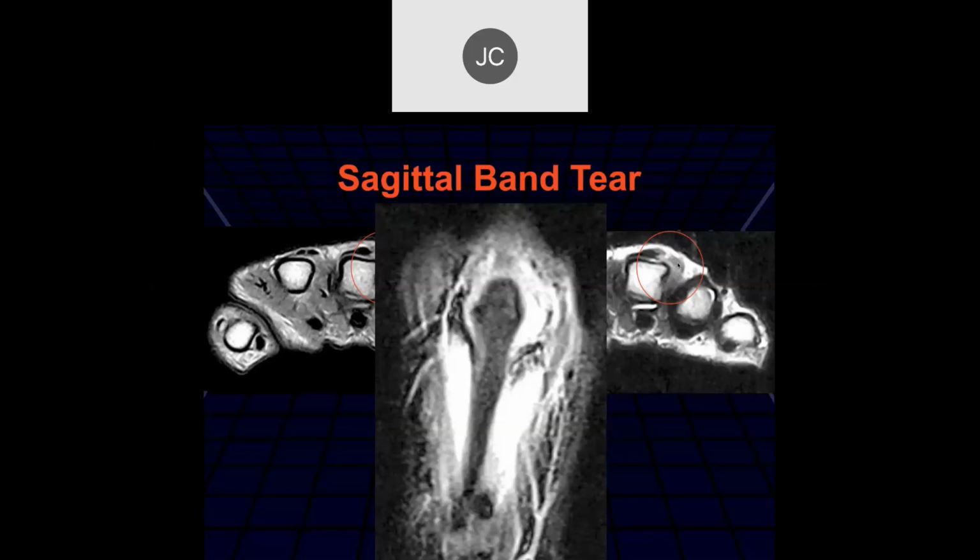And you can see a marked thickening of that ulnar-sided sagittal band. This is high enough where I believe this patient underwent surgery. John, what do you think? Well, being a boxer, probably would want surgery, but it all depends on the individual. I know one thing: if he's a professional, I wouldn't argue with him too much. Yeah, right.